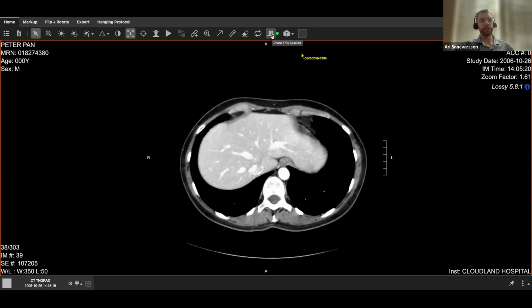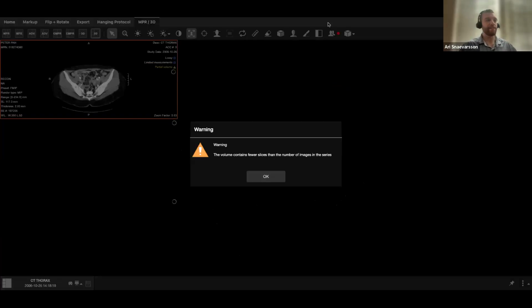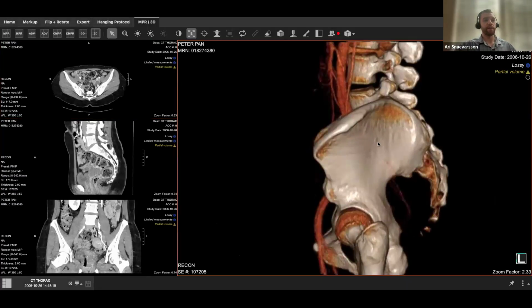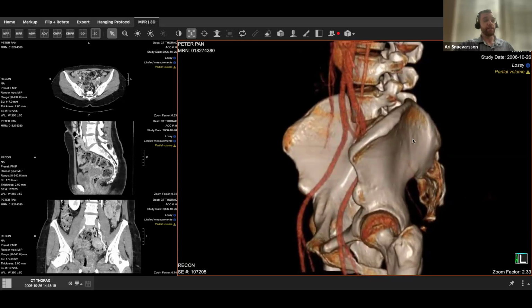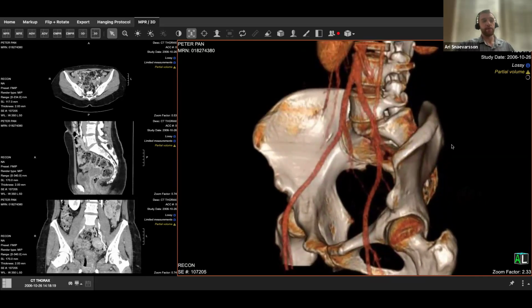So I'll turn the simultaneous screen share off to show one more consideration that could be helpful. In some of these basic cases, just looking at this 2D base model might suffice. But in some cases, we want to get a deeper look. And we've actually got a 3D rendering capability that's specific to any CTs or MRs we have. This one just has a limited number of images. So as you can see here, we are seeing an actual one-to-one rendering of the three anatomical views taken during that CT procedure.